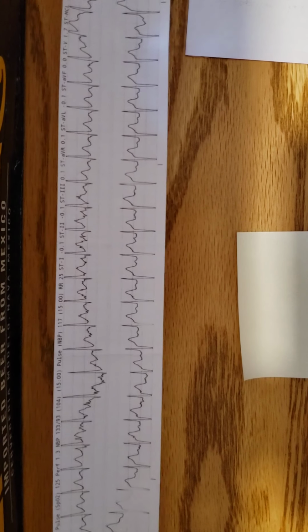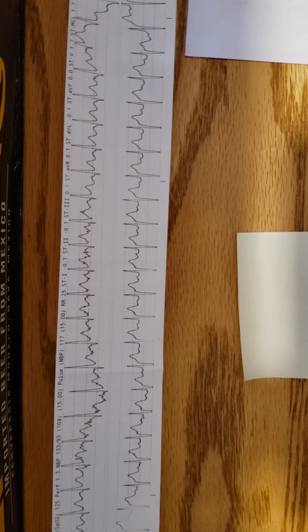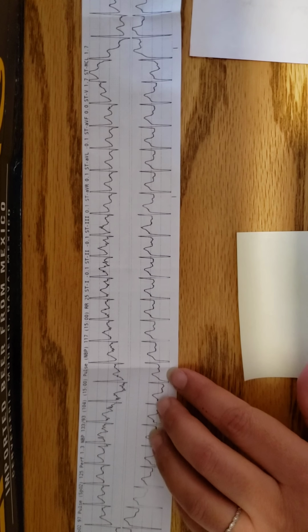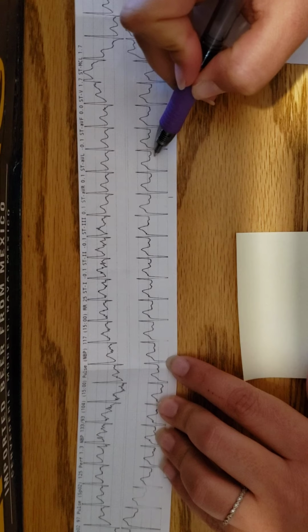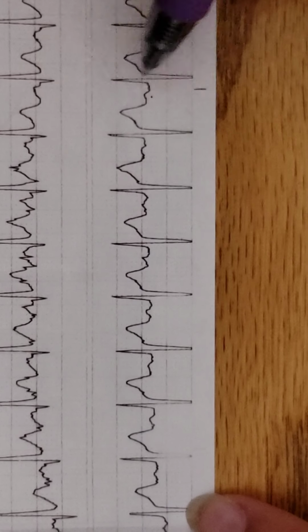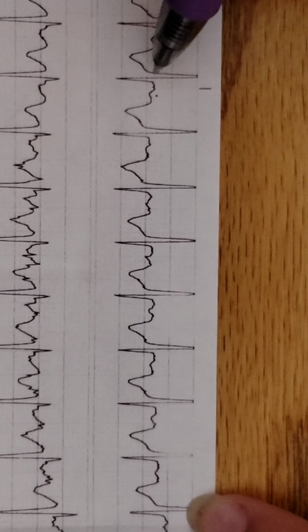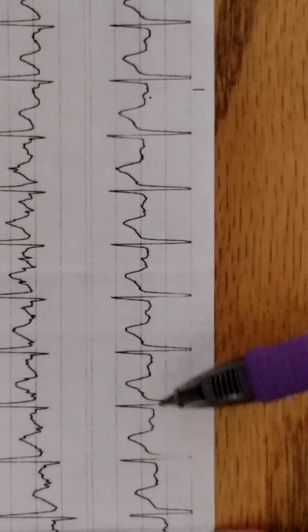And then this one, it's hard to read because it's so fast, but this is just a tachycardic patient, okay? It looks really quick, but if you look down here, you can clearly see a P. Let me zoom in for you, sorry. You can clearly see there's a P, a QRS, a T. The S goes down, comes back to baseline. We have this T. It's just at a really quick rate.